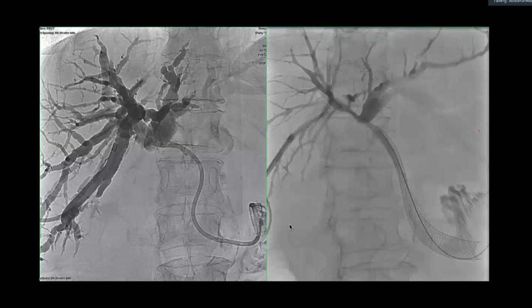So this almost looks like a nephrostomy tube. There's a pigtail here, there are some side holes here, and there are some side holes here. So then all the bile drains into these side holes and then comes out through here. And then finally, this is what a stent looks like. So, you're the second person who said stent, when actually there's a pigtail catheter.